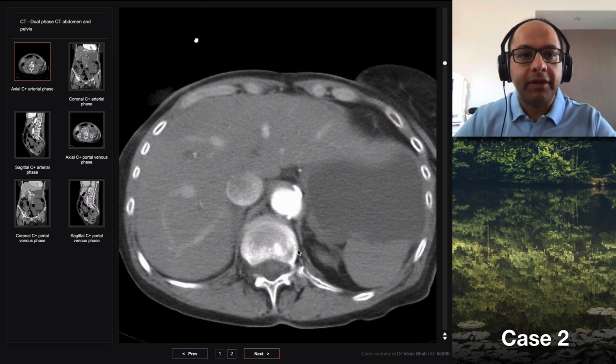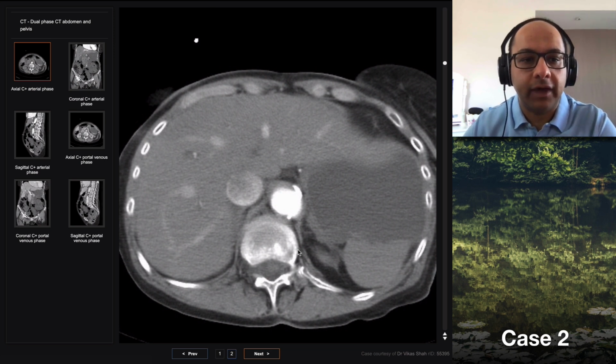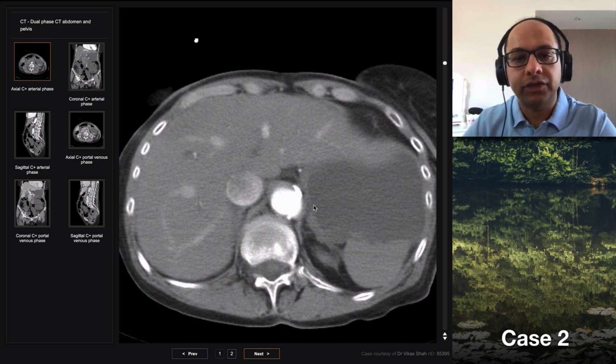So I want you to talk me through, first of all, what kind of phases you've got here, and also, is there anything in the ideal world that you'd have added here, and why? And then also just talk me through your findings as well, please.